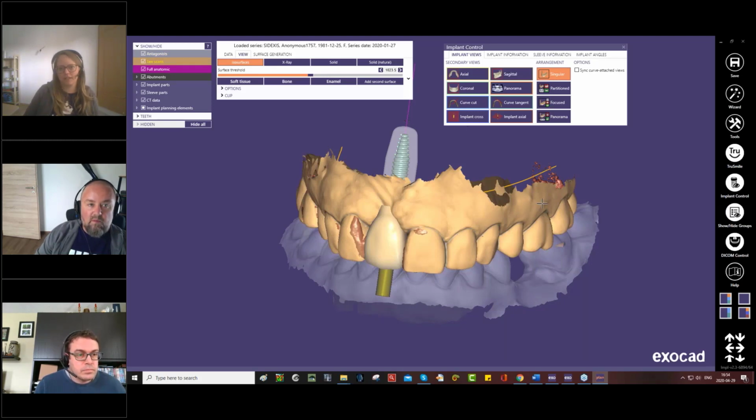It's normal XML data. But there's a big warning, and in the report there's a warning as well. There will be information when you load such an implant library. You will get a warning on the screen when you load it. It will say this is an unsigned library. Are you sure you want to continue? And you can do it if you want to.